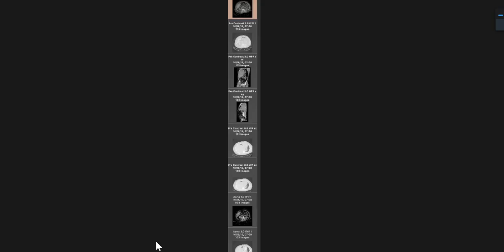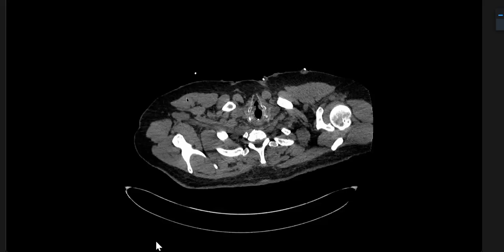Okay. Can you see just the CT scan, or can you see the side window thumbnails as well? There is CT scan I can see. You cannot see any thumbnails along the border? No. Okay, so that's the CT scan for you. I'm going to give you the remote control. All yours.